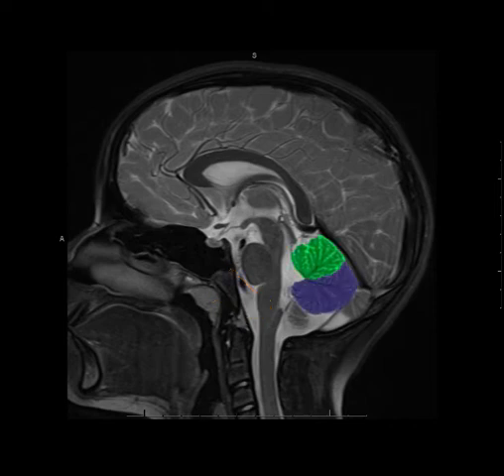Next we have the cerebellar vermis. Somebody must have thought that it looked like a worm because that's what vermis means in Latin. Basically, you could think about it as being divided into two separate but unequal parts, the anterior lobe, which is superior, and the posterior lobe, which is basically inferior. But if you remember that these structures were named based on the neuroanatomy of quadrupeds, it makes a little bit more sense. The demarcation point between the anterior and posterior lobes is the primary fissure that I have outlined here.